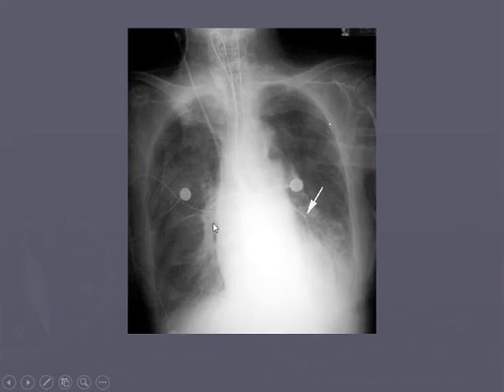Okay, what's next? We have our everything else. All right, so we have our marker. Looks like we have the central line here. Actually, that's a swan, I believe, coming down here, and then going up there. There's a tip right in the pulmonary artery. And then what's this up here? It comes down, it goes up, it comes down, and there's the tip.